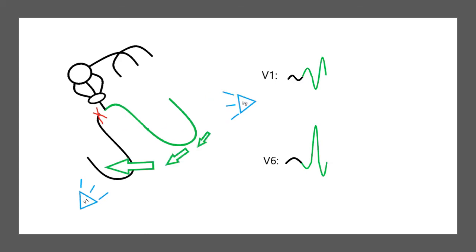Now, after that happens, something unusual happens. This is where the aberrancy is created. So cardiac cells, in the absence of pacemaker cell conduction, do have the ability to conduct cell to cell. The muscle cells can innervate themselves. Now, when they do this, this is an inefficient method of transmitting electrical activity, and so it takes longer, and it happens on a magnitude much greater than if you were to have used the conductive network. And so what you end up with in V1, because it's closest to the right ventricle, is a much taller R wave on the second time through. So there's already an R wave here, and now we have a second peak, a second R wave, and we term that R prime, or you'll sometimes see it annotated with just an R and a dash above it.